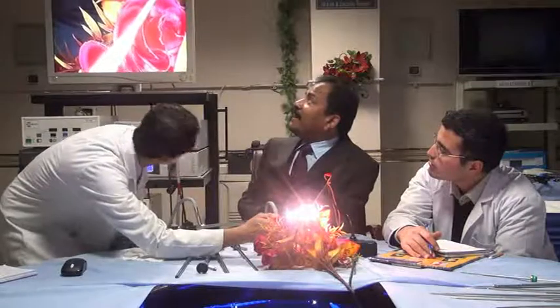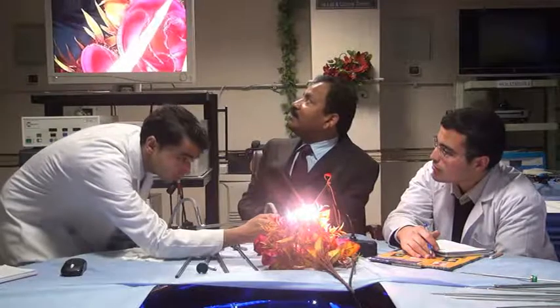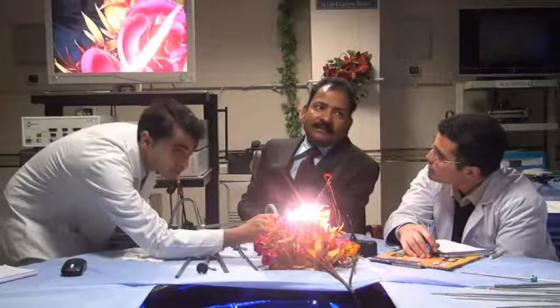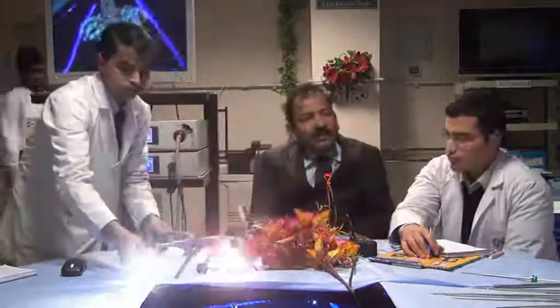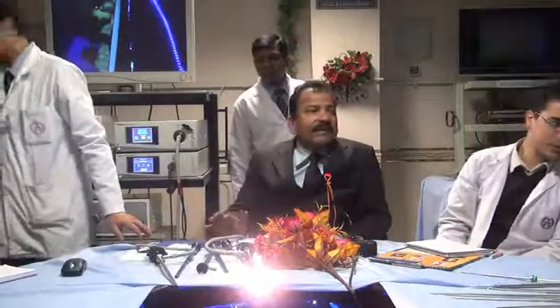See the green behind the red. If you see the green behind the red, in this one, the green also has an equal participation as the red. But in the other, the red will dominate over the others. So this is regarding the 3-chip and the single chip camera. Now comes HD and SD.